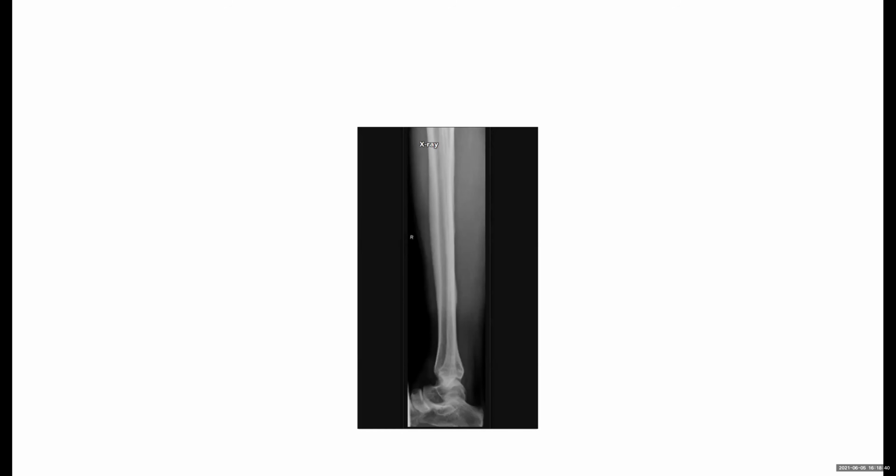Okay, he's an athlete. So there is also another possibility of stress fracture because he's using his legs too much. So maybe these cortical thickenings are due to stress fractures from using them a lot. I can't see anything else in the surrounding soft tissue or in the ankle joint, just these thickenings. It could be due to stress fractures. Okay, this is the MRI for the same patient.